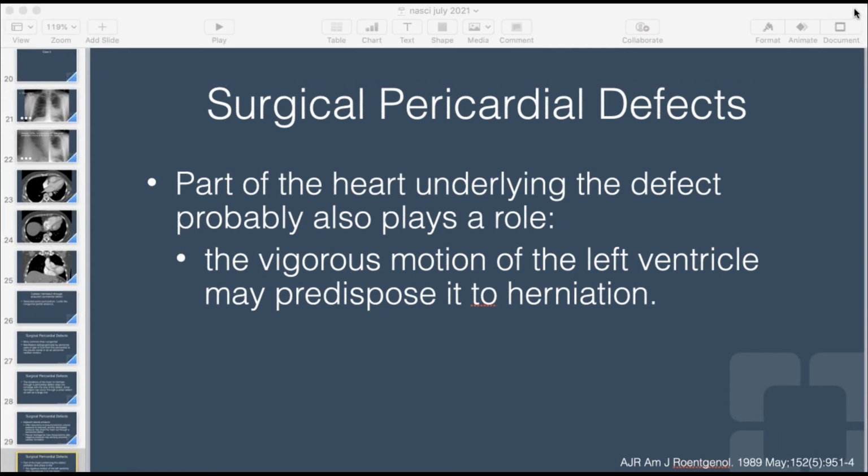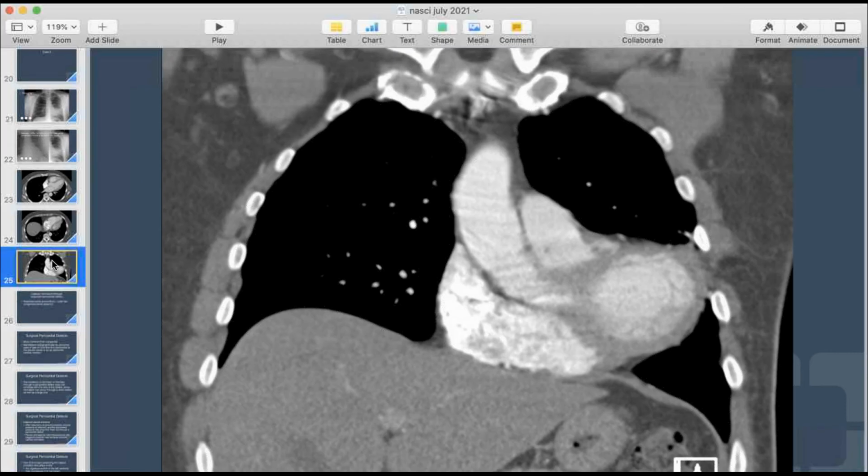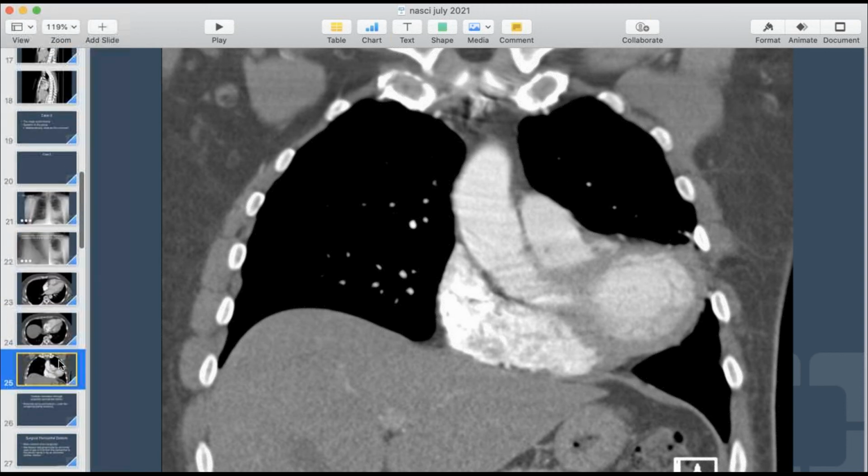During the surgery, some pericardium was resected, and when you look at the images, it looks like a partial congenital absence. This is more common than congenital, clearly, right? The congenital absence of the pericardium is rare, and we're always doing heart surgery on a lot of patients, so clearly it's going to be more common.